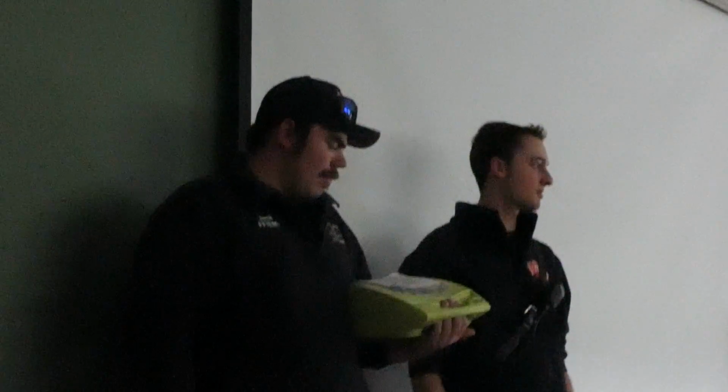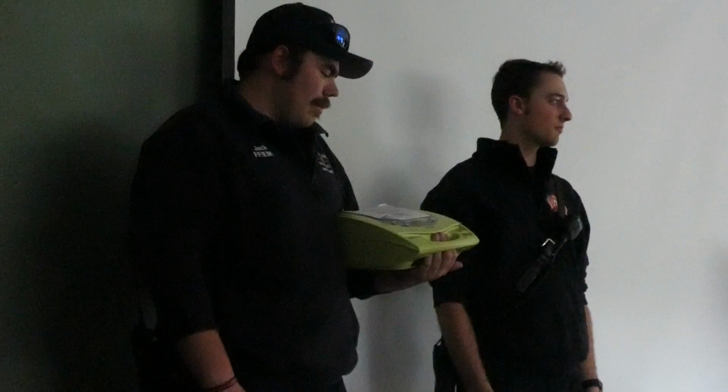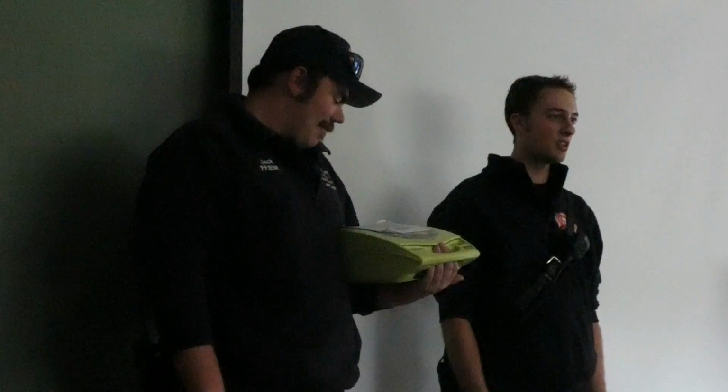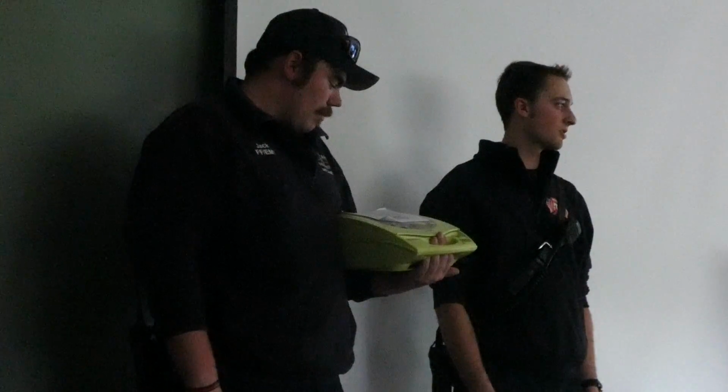You need an AED if somebody's in cardiac arrest, which means their heart stopped beating. So if you see somebody that goes unconscious, or you come across somebody, the first thing you're going to do is check and see if they have a pulse. And if you can't feel any pulse, then they're in cardiac arrest. So, you guys know how to do CPR? Yes. Yeah, some do.